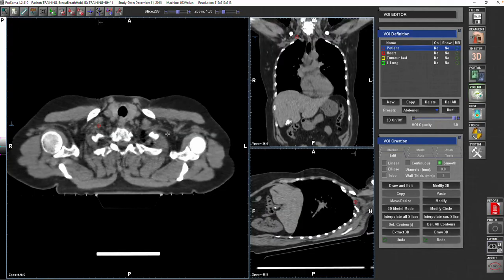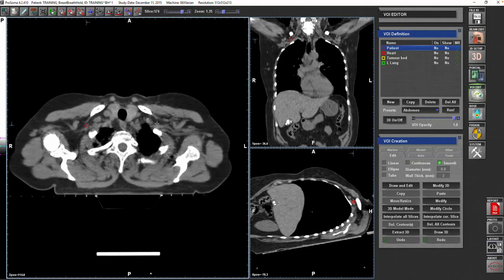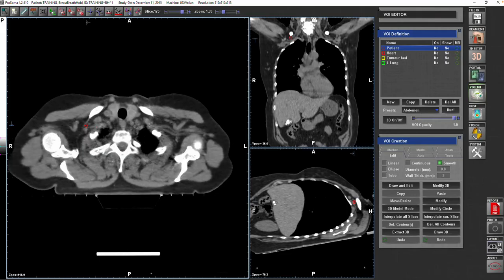The second step you need to know is when you follow this artery and it reaches a line between the first rib and the clavicle. You see this clavicle, this is the first rib. When the artery starts to move into the space between the clavicle and the first rib, here you start your level 3. So you need to familiarize yourself with two points for the subclavian artery.